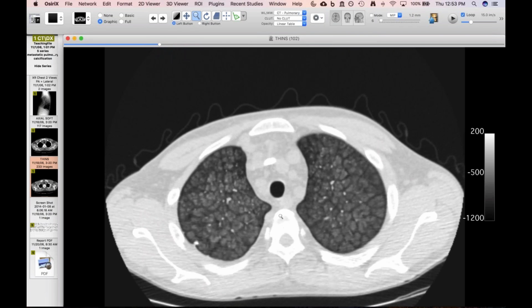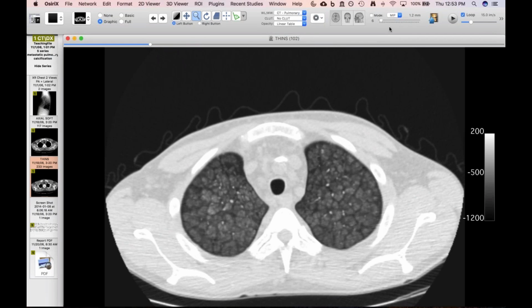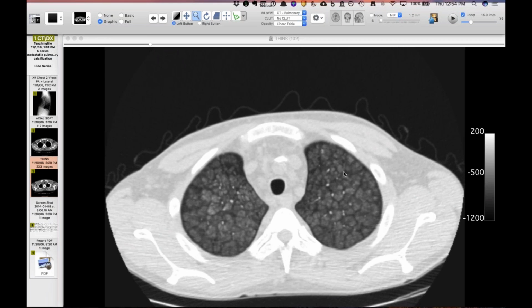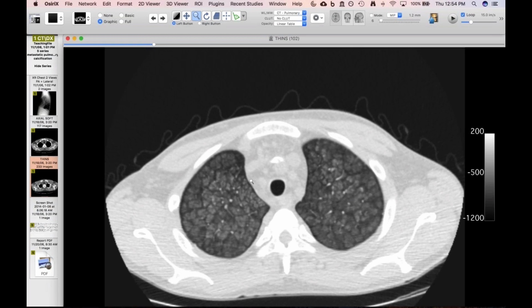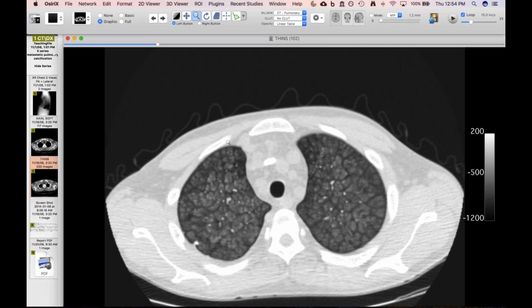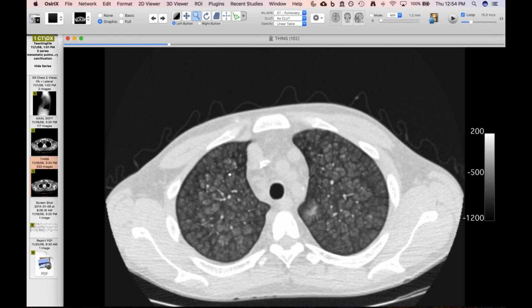Yeah, that's beautiful. This is the best one I've ever seen. You can teach rosettes on CT and radiography in this patient. Call them the rosettes. You see the same rosettes in pulmonary hemorrhage. So I think you could view this really as a calcified pulmonary hemorrhage.